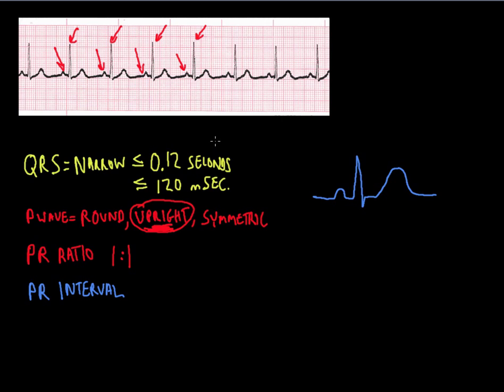But I have a P wave at the beginning, then I have the QRS, and then I have a T wave. Not my greatest effort, I admit, but it gives you the idea, and it allows us to measure what we're looking for here. So I want to try and determine where is the beginning of my P wave. I'm going to highlight that here in orange. It starts right there. That's the start of my P wave.